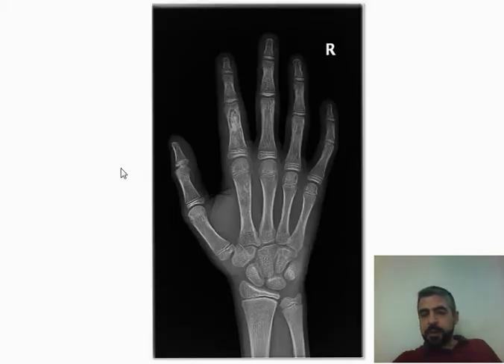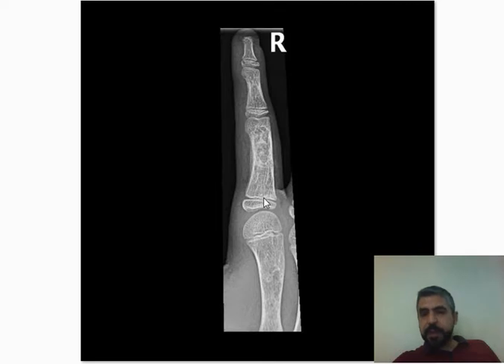Another example of an enchondroma in the proximal phalanx of the index finger, and you can appreciate that it is well defined, intramedullary, has a narrow zone of transition, and has a cartilaginous type of calcification, that is rings and arcs. Here is a magnified view of the same lesion. It is obviously well defined. Usually it can cause some expansion or remodeling.